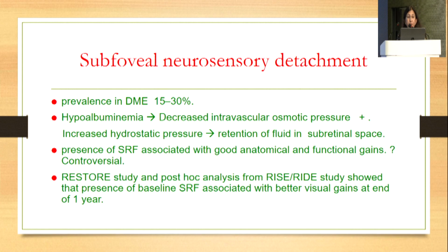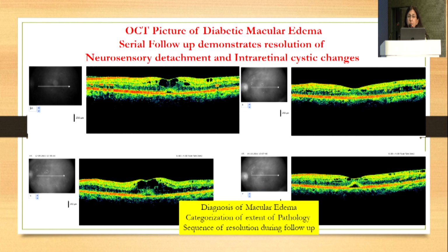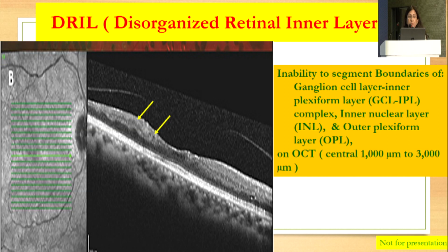Coming to SRF, in some studies, like RESTORE and RISE, it has been shown that the presence of SRF actually is an indicator of better visual gain in the long run. So this is just a patient showing a resolution of edema with treatment, anti-VEGF injections.